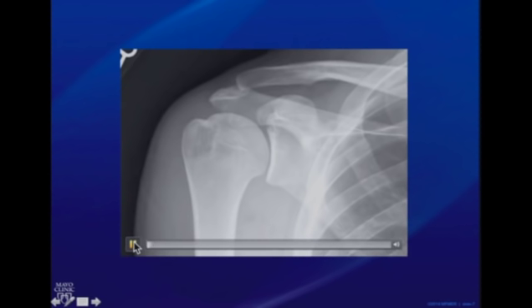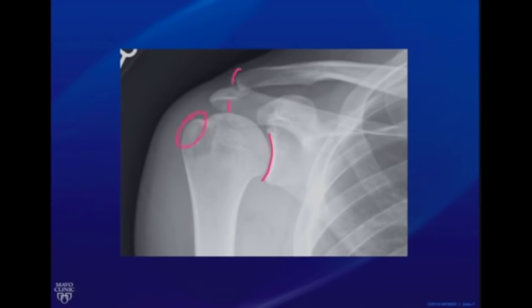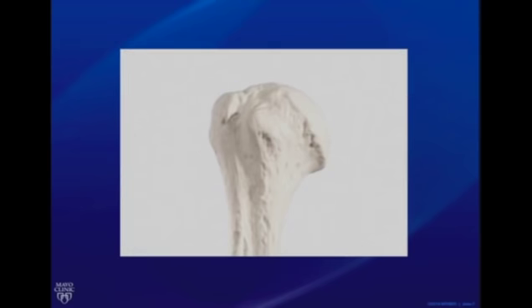So if you look at an X-ray, it's easy to identify the landmarks. That's the glenoid fossa. That's the subacromial space where the supraspinatus resides. That's the greater tuberosity. That's the acromioclavicular joint, and that's the coracoid process. So that way, if you now look at the humerus, we again identify the lesser tuberosity and the greater tuberosity, and then we understand that within the groove lies the biceps tendon as the tendon becomes extra-articular.